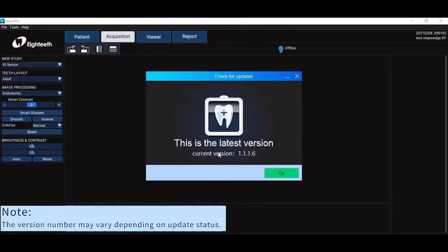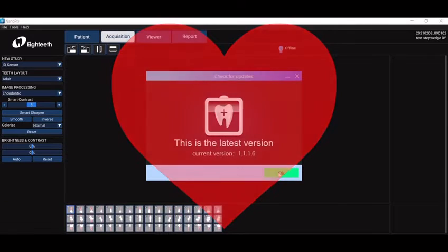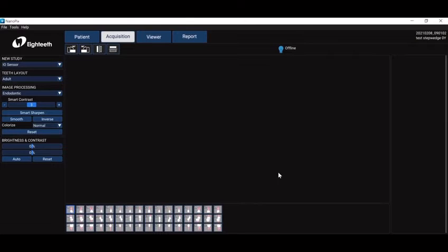And then, once the upgrade is completed, all you have to do is close the software. You can see we're already updated. Close the software and open again. I really love this feature because no other software I've used actually offers this. And if they do, they'll usually do it once, and then the rest of the updates are fairly expensive. So let's go ahead and take a look at setting up our settings.